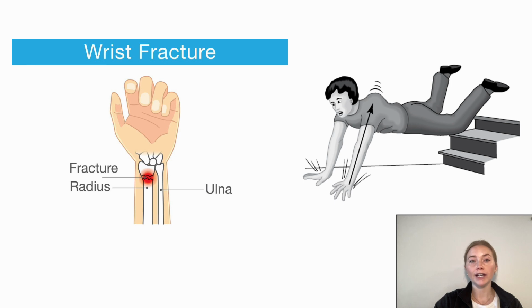No matter what field you're in, it's good to have a basic knowledge of distal radius fractures. They usually occur from this FOOSH, fall on an outstretched hand mechanism, and many hand and wrist pathologies are the result of this as well. Distal radius fractures are especially common in the elderly and pediatric populations, and the type of distal radius fracture can be categorized by the fracture pattern. Because they are so common, many of the fracture patterns have been named and are characterized based on whether the fracture is intra or extra-articular and which anatomic area of the radius is affected.